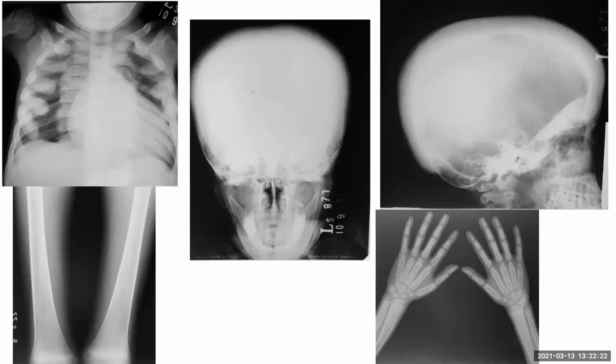And in the hands, I can see the bones are also loosened, with coarsening of the trabecular markings and some expansion of the metadiaphyseal regions. And in the tibia and both femurs also, I can see some expansion of the metadiaphyseal region.